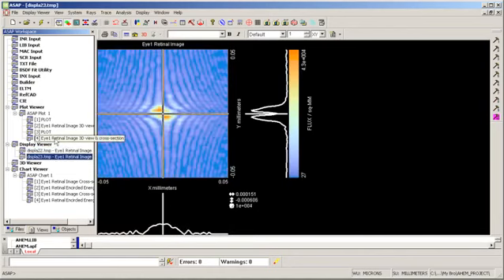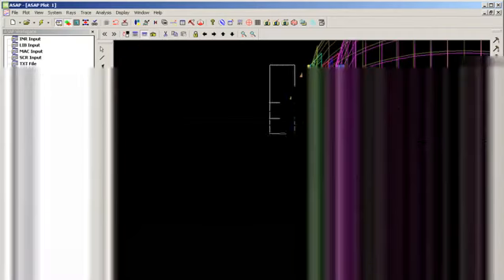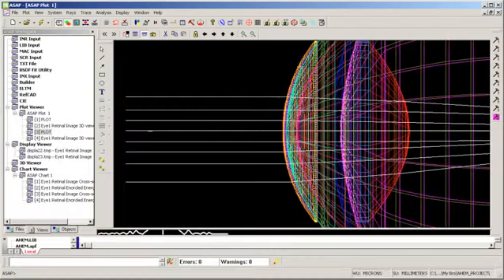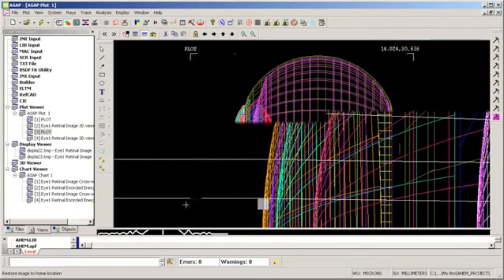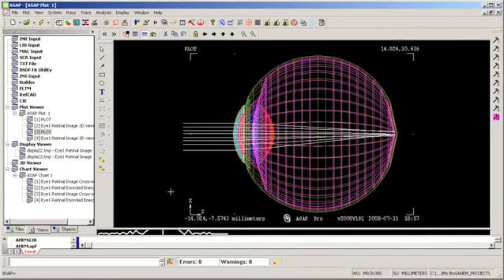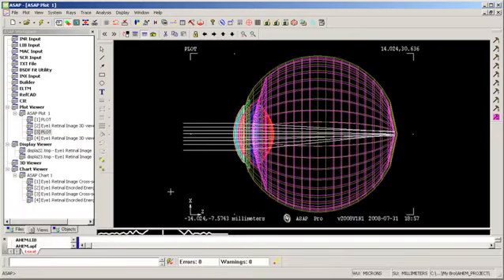So this is my contact lens. Right here we can zoom in on it. It's a toric contact. A little more here. You can see this layer on top of the cornea. It's a different color than the cornea. So that's contact lenses in AHEM. You can either import your own CAD or generate one in ASAP to load into AHEM, and then you can reposition it with the splash screens.